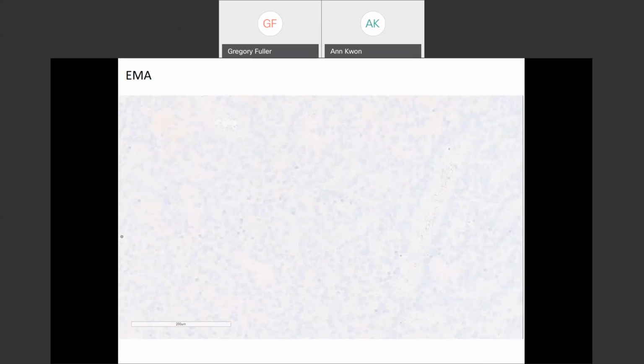What do we see here? All right, this is 20X because I don't have the slide scanned at 40. It doesn't matter. You don't see anything more at 40. Yes, Dr. Trivedi, you see nada, nothing. Does this mean that this tumor is not an ependymoma? No, of course it's an ependymoma. Dr. Trivedi says, nope. I tend not to like nope, yep. Dr. Harb, check the control, absolutely.